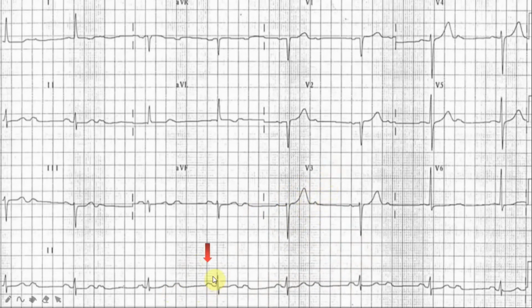Once again, particularly if we look at the P wave, it is wide and a bit bifid. That usually happens if there is a left atrial enlargement or left atrial hypertrophy. And again, if we look at the P wave followed by a QRS complex, then a P wave followed by no QRS complex, then a P wave followed by a QRS complex, a P wave followed by no QRS complex, this is a classic presentation of the second-degree heart block. Probably it is Mobitz type 1.